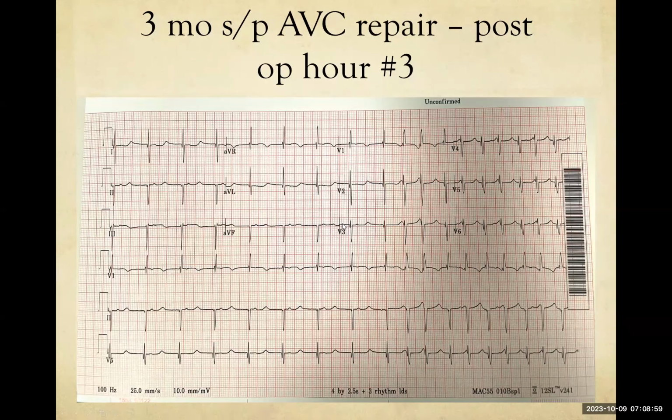So we would expect that if you pace the atrium at, say, 160, you would actually see this morphology of QRS, not this one. You would basically suppress the VT by conducting down the AV node. Does that make sense? Yes. Thank you. Okay. Now, what practically happens, unfortunately, is that you could pace the atrium and pace faster.